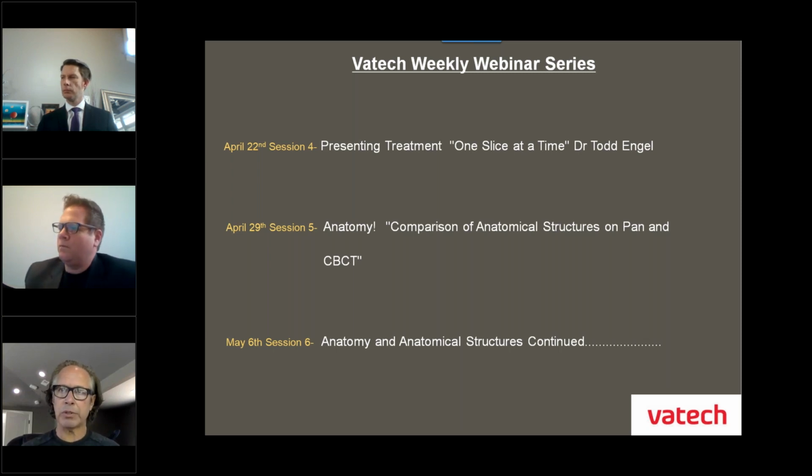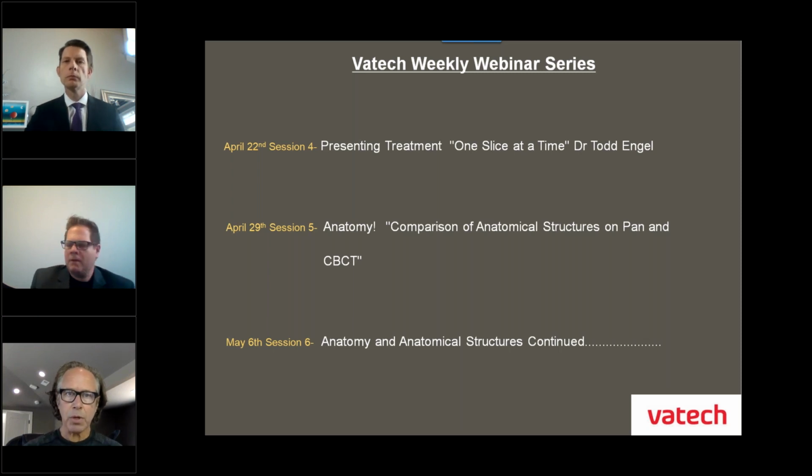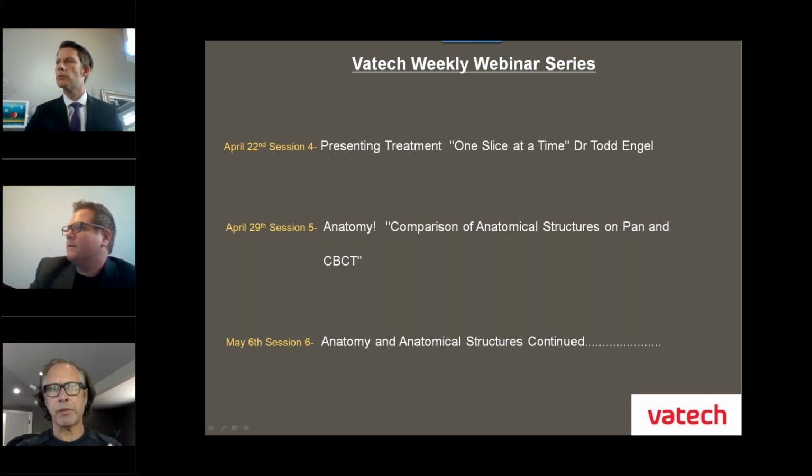I think once you understand just the fundamental basics, maybe 4 or 5 things and how to do them, which are actually quite easy, daily with every patient, it will give you a strong fundamental basis, and then you can grow off that. You can dig deeper into the 3D pan and look at the Hounsfield units, and then start to look at positioning implants and spinning around in the oblique position to identify if there's any perforations in the sinus, or mapping the nerve, etc. But it's literally a language.